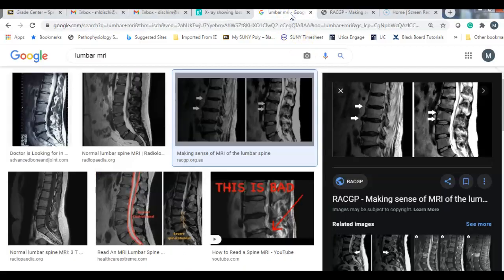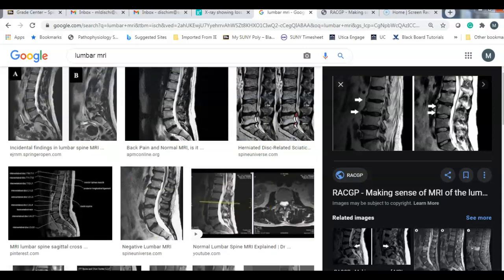And this is bad, obviously. And you could see they're pointing at that same presentation that almost looks like the same picture. You know, the one thing before I log off, and once again, there's my very, very basic, oh, there's a good one, here. So you can see right here, negative MRI, and you can see how much more space the spinal cord has. So, that's a bad thing.